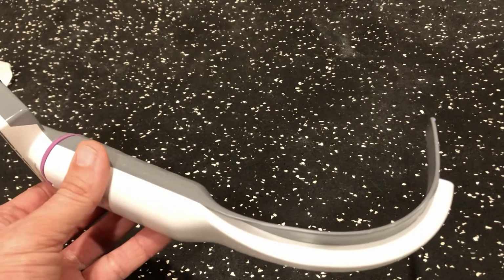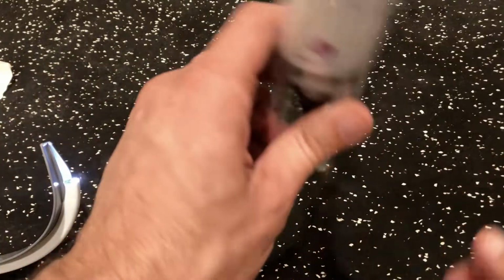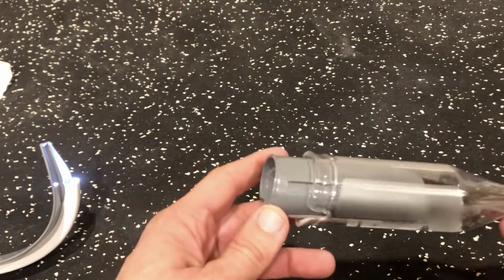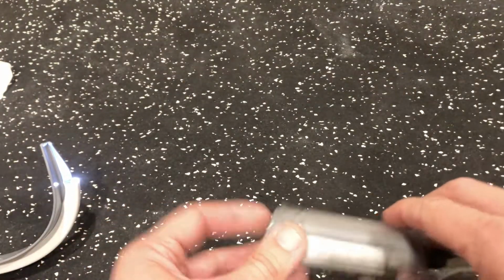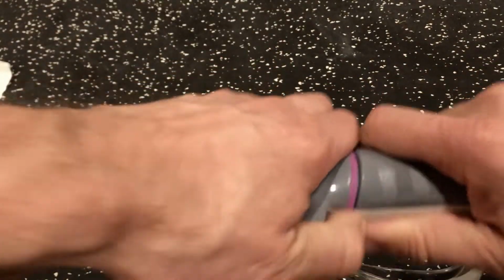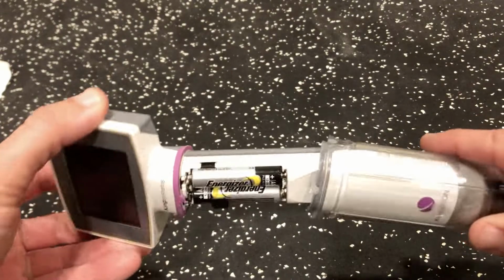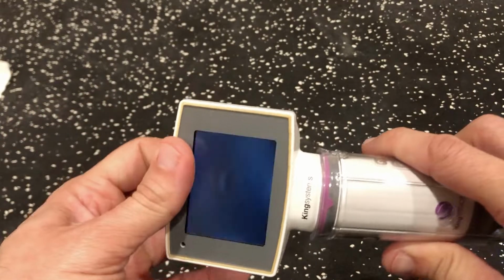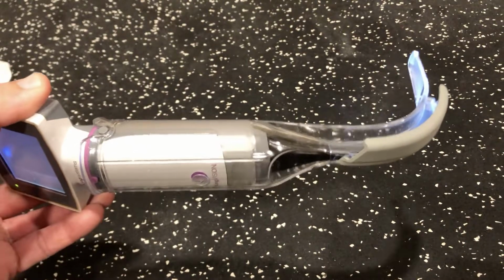There is an additional system that we have for this video laryngoscope. It is the PEDS portion. So this is a little bit smaller connector, nothing different except a smaller connector and a smaller blade. The blade for the PEDS is a 2C, and for adults it's a 3. And the only difference for our video laryngoscope for the PEDS situation is that you want to take the blade apart, and you also want to take the battery component off, and then that fits the PEDS component. Now we have the ability to use this for children around the age of 4 to 10, 11, or 12.